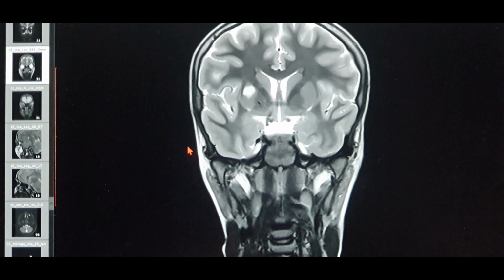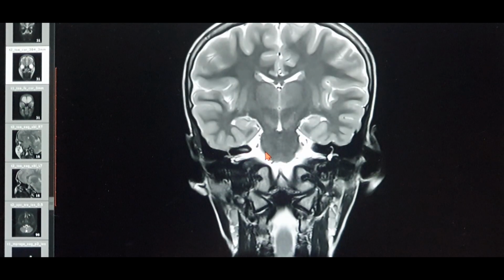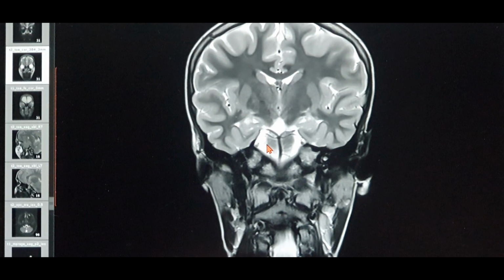So, rounding up the basic differences. If the patient undergoes a surgery, for example a CSF leak repair, or has any herniation of brain through a skull base defect, then once you do the surgery and get a post-surgery scan, this is for the ENT and skull base surgeons watching this video. You should normally do a post-op scan 36 hours after the surgery for the CSF leak.